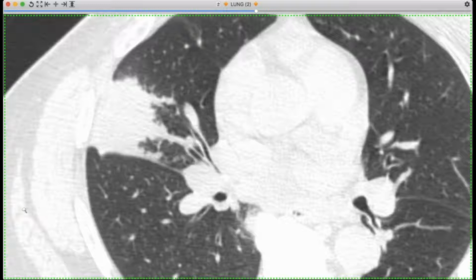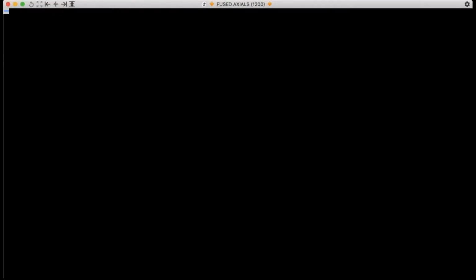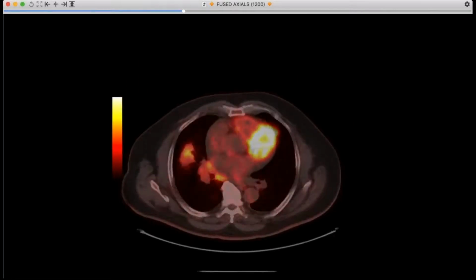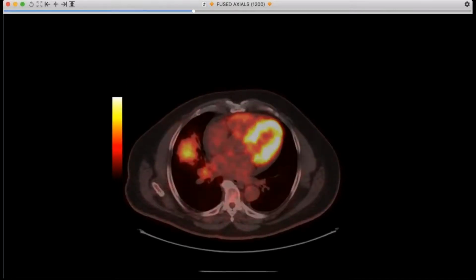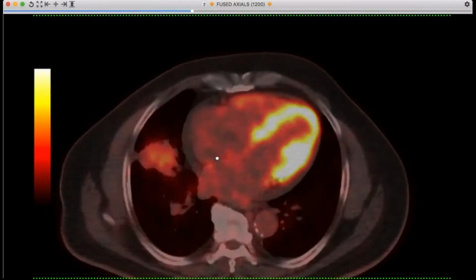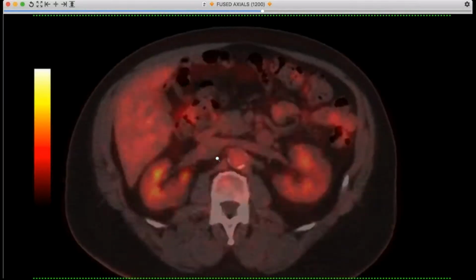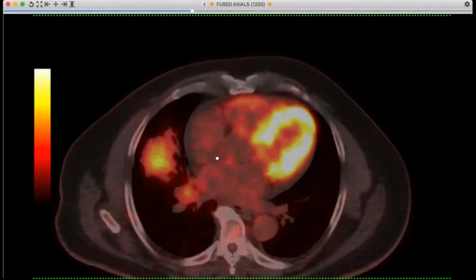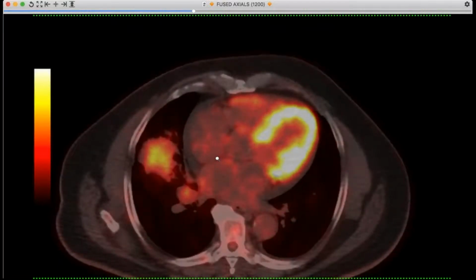Very odd. Jeff, are the pathologists pretty confident that this is a lung primary and not some other unusual tumor that has small cells? Is it TTF positive and all that? I don't remember that specifically, but small cells aren't always TTF positive. They're usually synaptophysin and chromogranin, which just tells them it's neuroendocrine. But the PET did not show any extrathoracic disease. So I think the PET is pretty definitive, and it started as a lung nodule that grew.